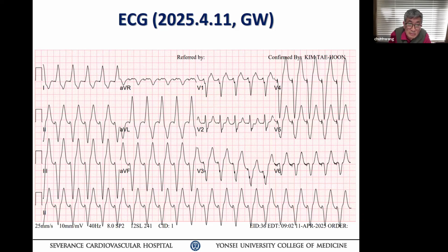Agree. But then the pacemaker has an extreme superior axis, almost like posterior septum, or maybe posterior apical, something like that. So this is not a good place to put a pacemaker, right? You want the dual chamber pacemaker implanted more septally, so you can make a more natural left bundle pattern or relatively narrower QRS complex. Those are the things you need to look for when you're looking at the pacemaker rhythm, okay?